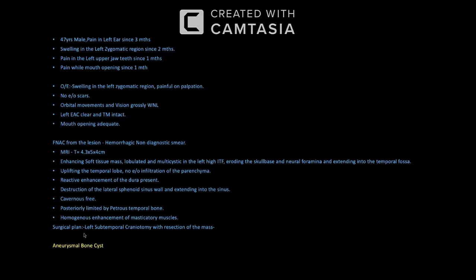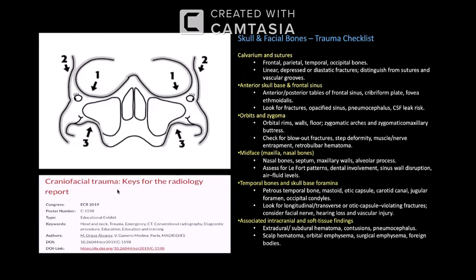So yes, this was a case of an aneurysmal bone cyst. The patient underwent a left subtemporal craniotomy with resection of the mass. Again, one more good article, especially to look at the skull and facial bones. They have given a nice checklist. So please go through this article from the e-posters from the European Congress of Radiology.